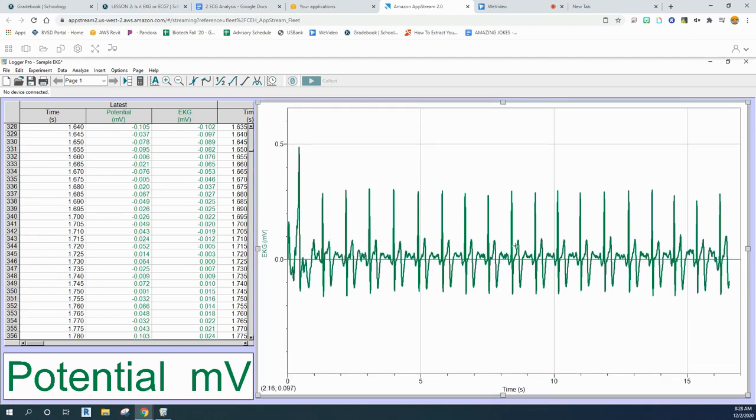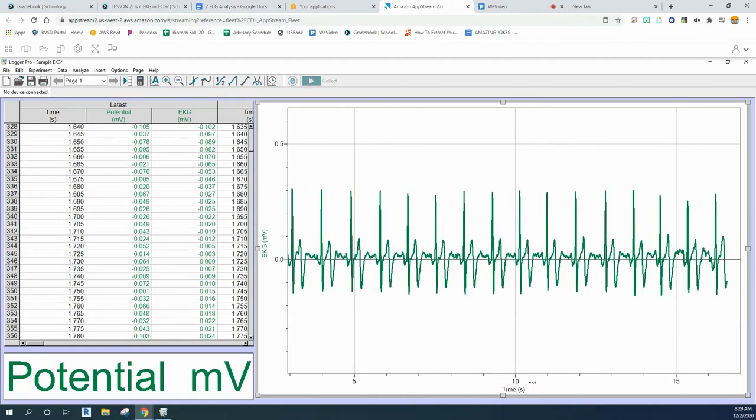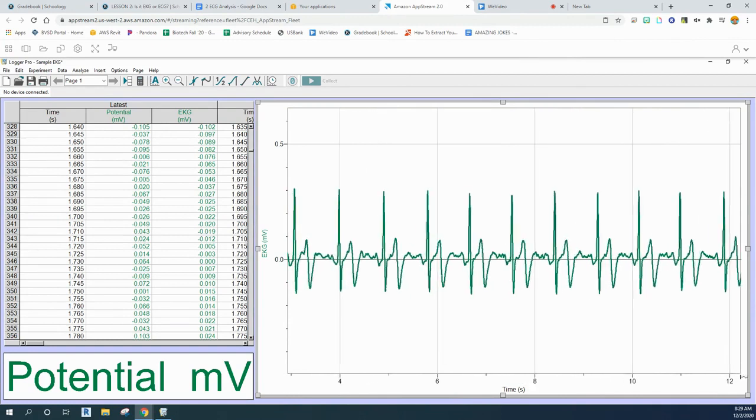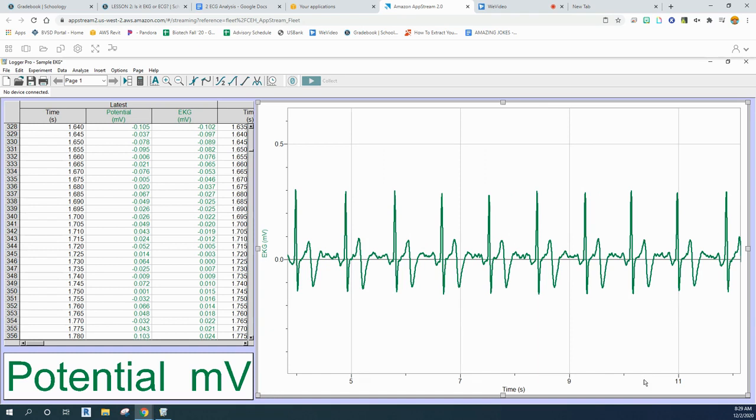And then I'm seeing a lot of different waves here, but I really want to see just a few of them. If I go to the bottom here, you can see this wiggly arrow with that solid black line. If I go too far to the middle, you can see it doesn't have the solid black line. So I want to get to the left side, and I'm going to drag that off that way, and I'm going to do the same thing on this side. You can see it's kind of getting rid of those last few. So I don't really need to see much here.